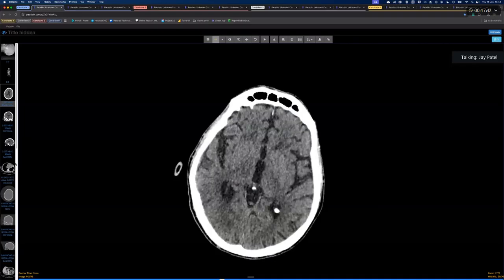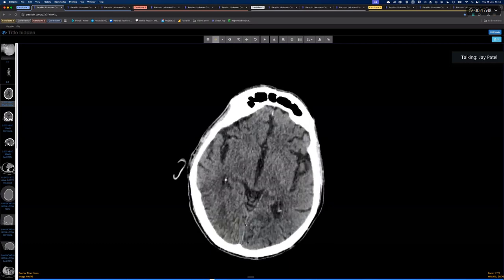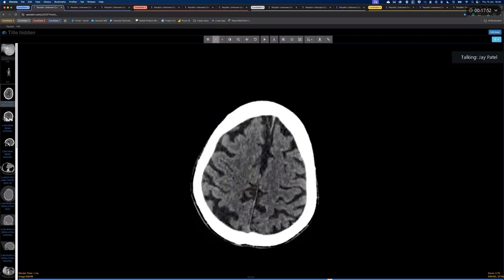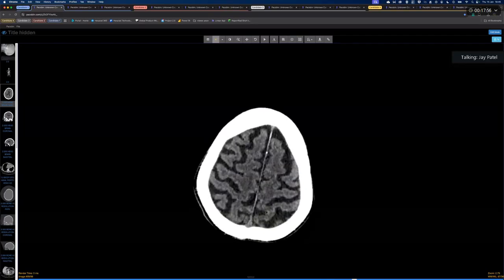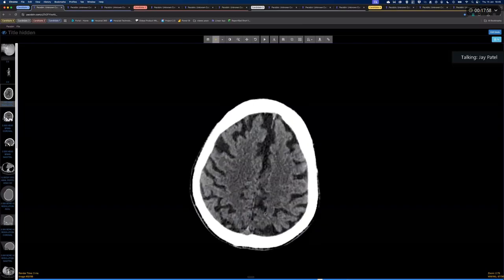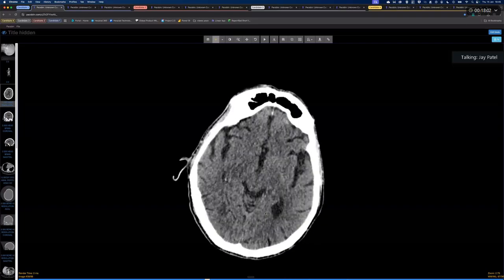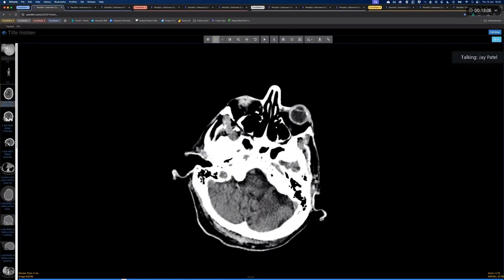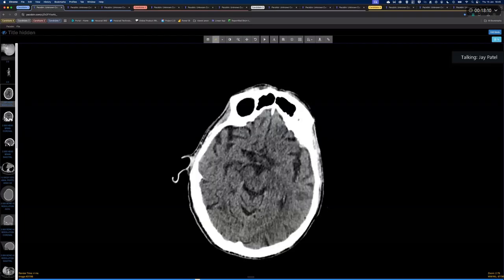Okay, so if I were to describe this, I'd say exactly as you started: non-contrast CT brain, and there are multifocal areas of low density scattered through the brain on both sides, both in the supra and infratentorial spaces. And then I would talk about trying to define that in a bit more detail.